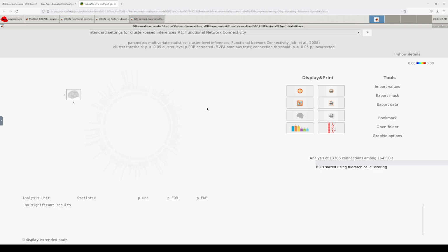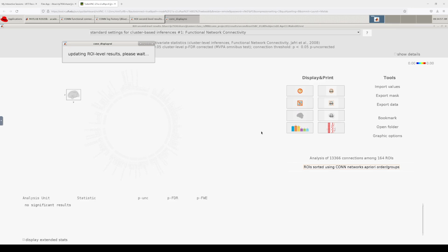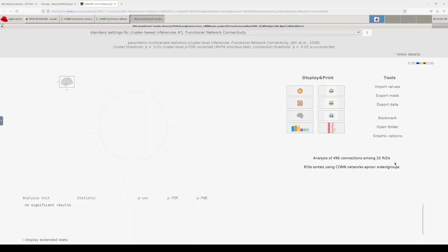Okay, so what are we looking at here? Nothing. Why is there nothing? Well, it's because so far there is no effect of age. So let's see if that's true with a smaller subset. So this was mixing both the structural and functional networks, which I do not recommend doing. I did it just because there's going to be overlap, so you want to pick one or the other or do a subset.